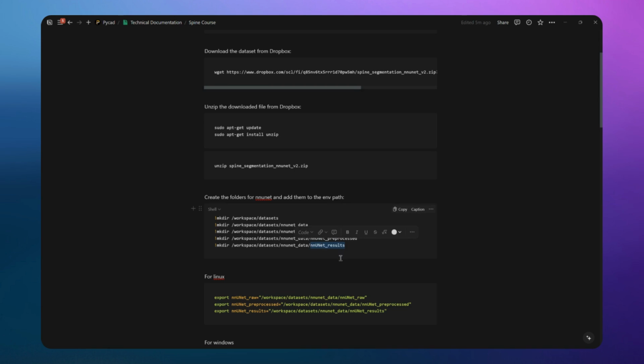Okay. For this reason, we need to create three of them. I already have the script that will help you to create the whole 5 folders. But if you want, you can do it manually. But I think you can directly run these, and it will create the folders for you.